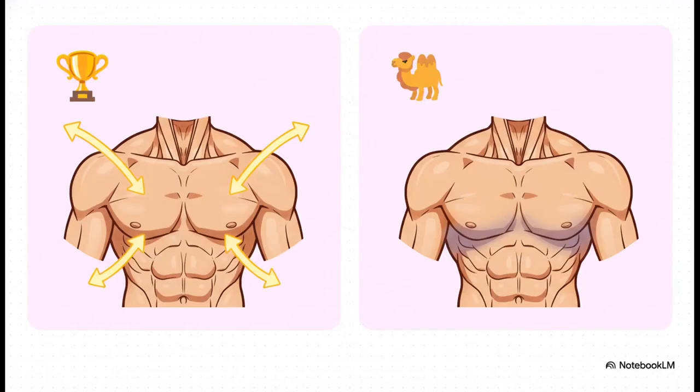All right, get ready for a term you are not going to forget. The technologist's goal is to pull the breast up and out to get that perfect convex muscle shape. When that doesn't happen, you can get a flaw that radiologists literally call a camel nose. You see how the breast sags and the muscle border becomes concave? It's this super obvious visual cue that the positioning wasn't quite right.